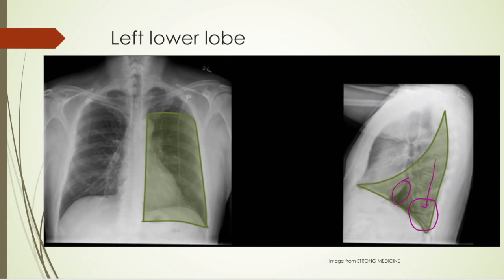And this just takes practice reading chest x-rays, looking at every one, and before long you can pick them out. And again, having a systematic method, which we'll go over here in just a minute.